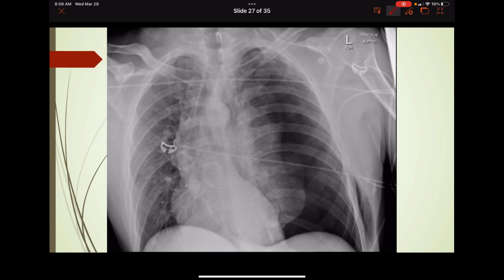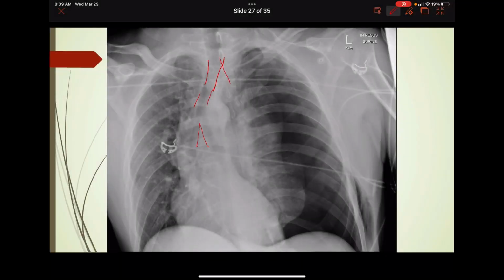And another chest. Here is trachea coming down. Actually, it looks like it's coming down here. Looks like this is carina. This is aortic knob. So things, I can already tell, are really shifted. And you can obviously look at this and say, man, this guy's got a lot going on. But I'm deliberately not mentioning that until we go through the systematic way of reading these, just so you don't miss anything. So you can see there's nothing in the trachea.